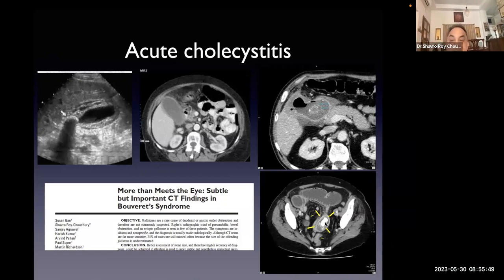First case, surgeon like you, gallstone obturation, small bowel obstruction. So the surgeon comes and says that, how is this obstructing? Because the stone is only this small, right? How is it causing obstruction if the stone is that small? So then we realized actually the stone is a lot larger than what is seen on CT. See, the stone is actually this big.